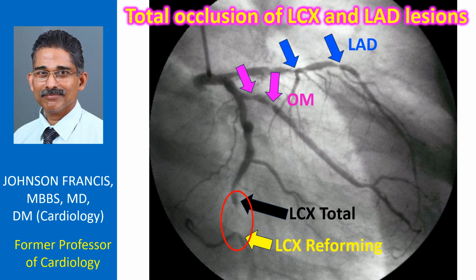When such a set of lesions are seen in the acute phase while taking up the case for primary angioplasty, it is customary to tackle the suspected culprit lesion immediately and consider staged procedure for the remaining lesions. Some operators may consider tackling all lesions if the clinical status permits. But in this case, complete revascularization is better done by coronary artery bypass grafting.